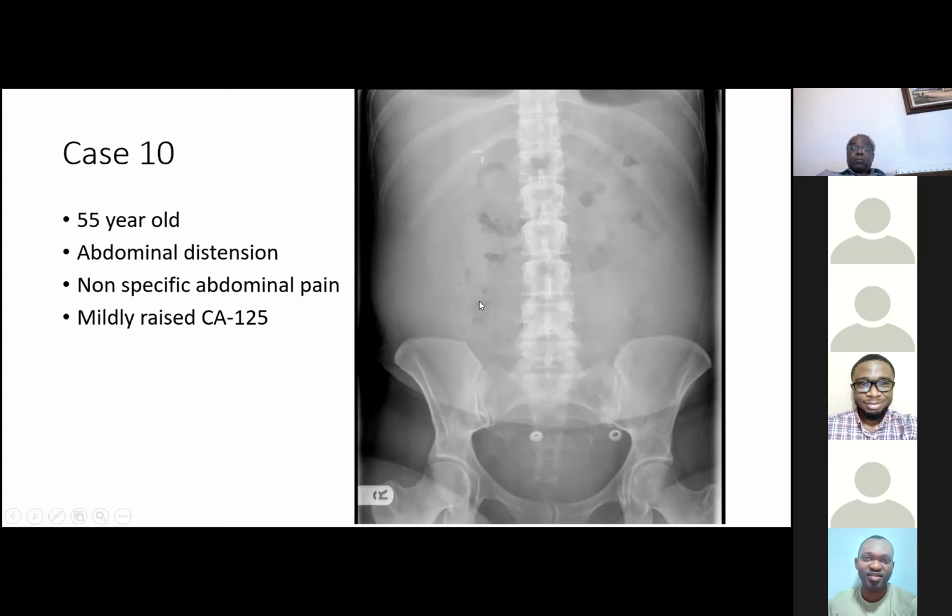Good. I mean, you're partly correct in the sense that it's a very good observation there. This is ground glass opacification in the flanks on both sides, and the flanks look to be bulging. Centrally are loops of bowel which are displaced towards the midline. So this is a patient whom on the X-ray clearly has evidence of free fluid or ascites.